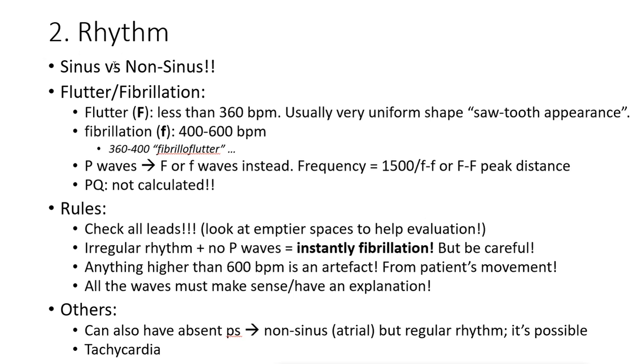Sinus versus non-sinus. You have to check, is there a P wave behind every QRS complex in lead 1 or lead 2? Lead 2 is typically easier to see. And are they positive, okay?